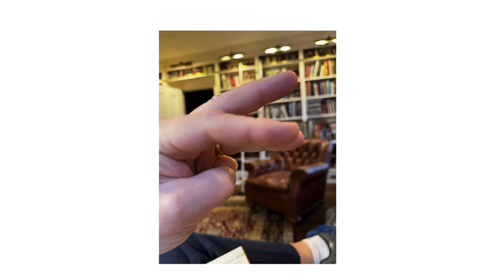It's higher than those 2 other ones, and then it will hook up to the descending aorta. So my middle finger is basically that hockey blade, and the 2 other ones that are lower are the right and left pulmonary arteries. So if we're at the level where we can see right and left pulmonary arteries, we're not going to see the ductus because it's up there, up top.